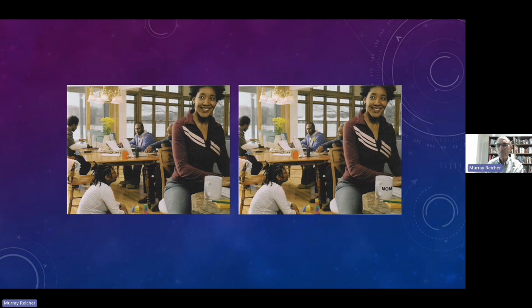And the question I have for you is, when are you done? Have you seen all the differences between these two images? Or is there a cancer here that appeared on the new exam that wasn't there previously on the old exam? And when are you done? When do you say, I'm finished? I'm satisfied that my search is complete? Is it after you've made the first finding, or the second, or the eighth, or the ninth?